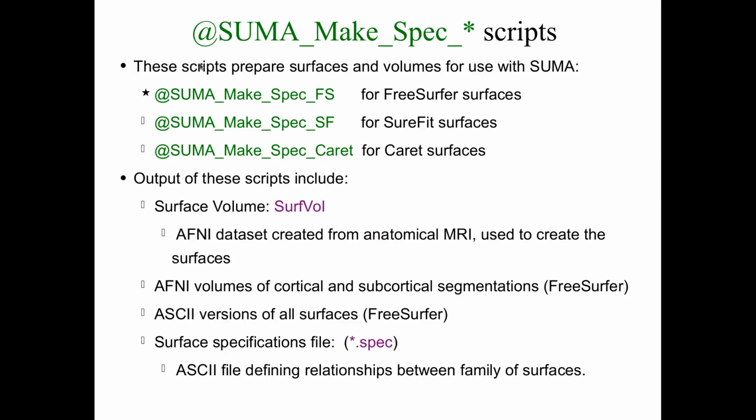Okay, so again, as I noted, for each of these software, there's a particular program in AFNI to translate their output. For FreeSurfer, there's basically a recon-all program, fairly stereotyped, kind of single use for default, that makes it pretty easy, and the same kind of outputs are presented, and so it's pretty easy to translate.